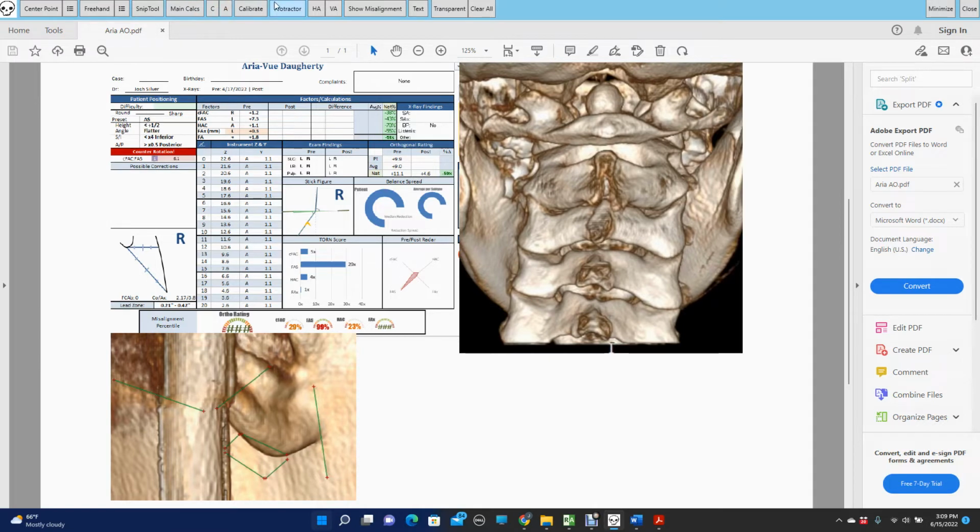I really am passionate about this project, and I just found that when I was doing my analysis manually, it was taking me about 40 minutes to scan to get through it using many different tools on my computer, and now we're down to about 10 minutes to scan. Today we were teaching, so it took a little bit longer, and we're able to help many more patients.